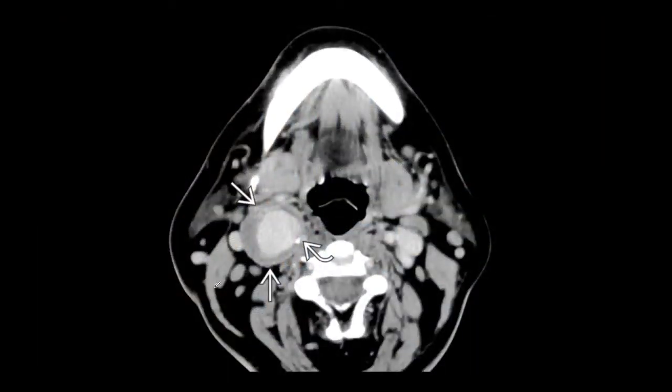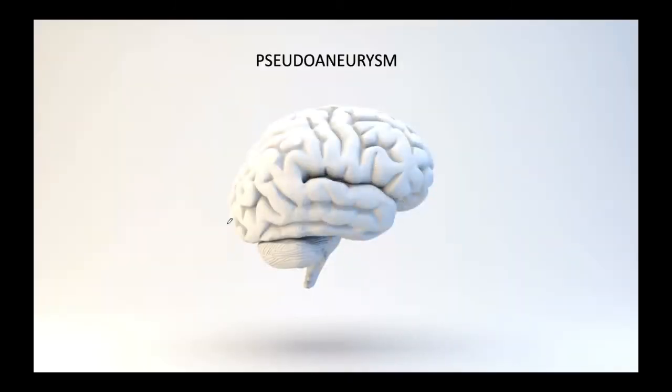And this is, anyone wants to take a shot at this one? Where the vessel is enlarged and it has an enhancing component where there is flow, and then there are parts that are not enhancing as much. So what is an enlarged vessel called? An aneurysm, right? But if it's associated with dissection, then you call it a pseudoaneurysm.